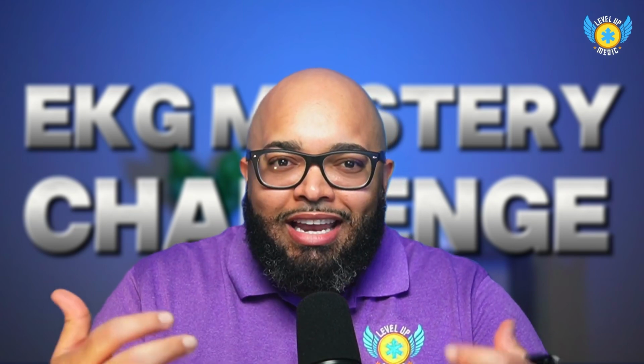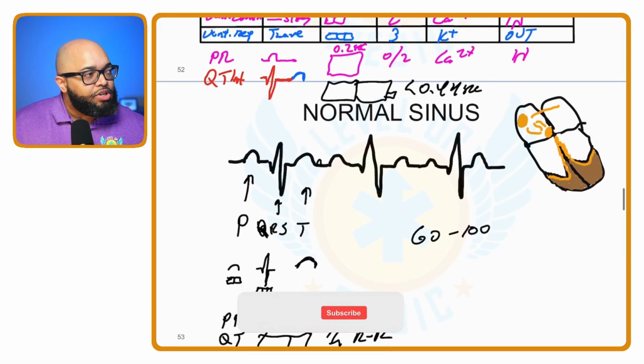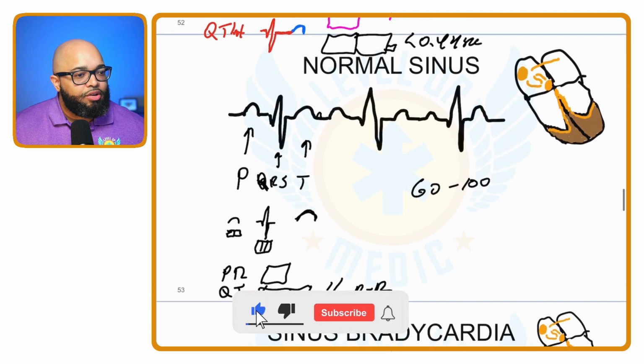So you see how we're able to tie in a lot of stuff together? All right. We were just on normal sinus rhythm. Let's get that back on the screen. All right, I covered that. Let's move on.